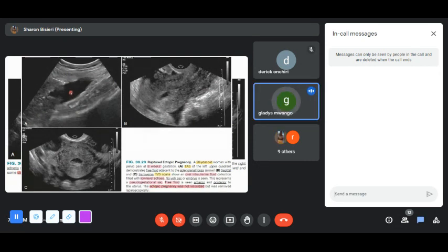Okay, so A is a splenorenal, though I don't see the spleen, I don't see the kidney. Yeah, I was also not able to see that. It looks like the iliac fossa, where you have the anterior abdominal wall and the posterior abdominal wall muscles and bowel loops, with a little pressure. That's the kind of appearance you'd get.